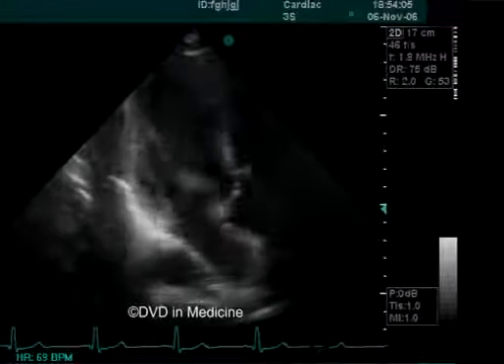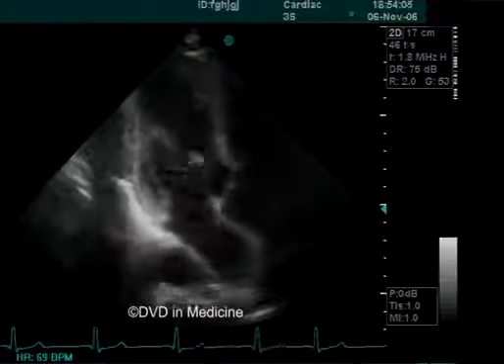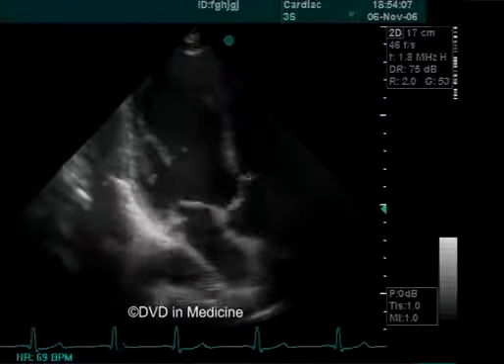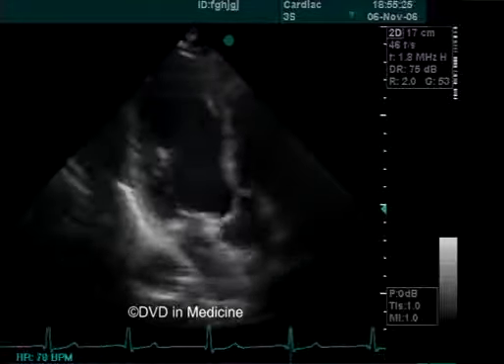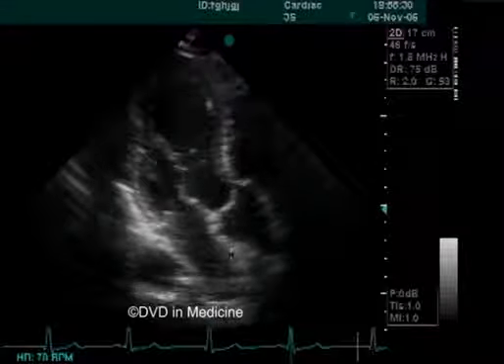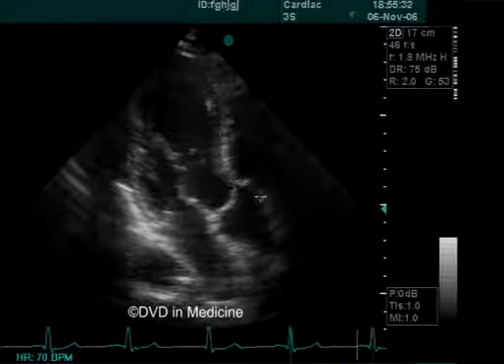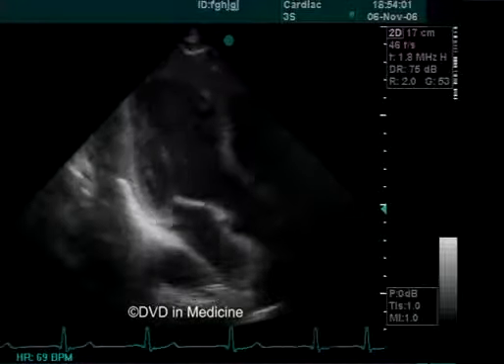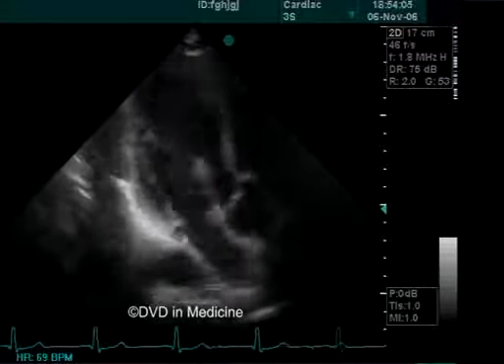In this image, one can easily evaluate the mitral and aortic valves. One has an optimal view of the left ventricular outflow tract. One can also check the direct continuance of the inferior wall of the aorta in the anterior mitral leaflet and the superior wall of the aorta in the interventricular septum. This is important for assessing patients with congenital anomalies of the heart.